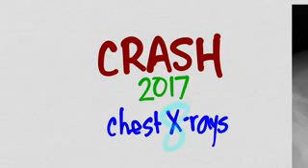Welcome everybody to Crash 2017, and in this video we're going to talk about chest x-rays, and we're going to really look at 8 chest x-rays that you should know how to read before you hit the floors. And this first video is actually going to talk about a methodological approach to reading chest x-rays.